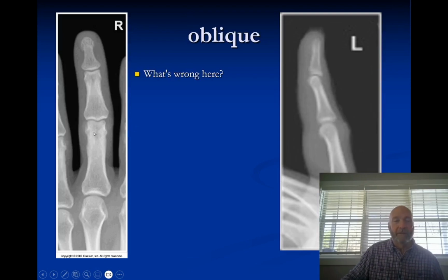So what we see here is just PA. It just doesn't look oblique at all. So it's under obliqued, and then over here what we've got is a lateral. And if you look on the lateral, it's kind of a spoiler alert for once we get to a lateral.